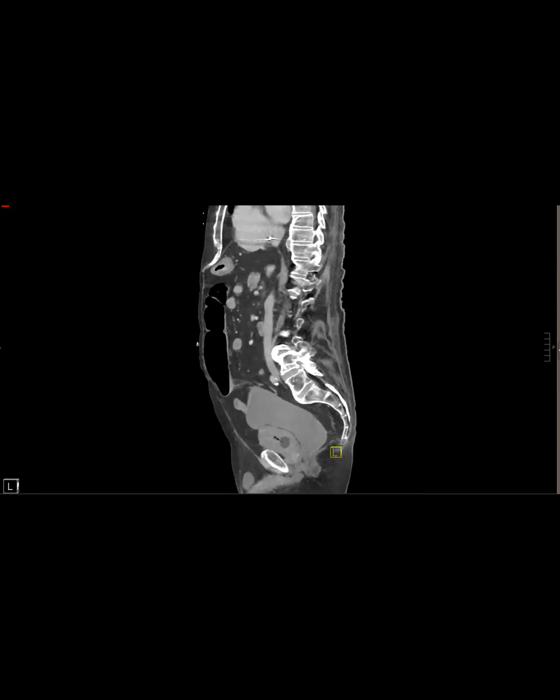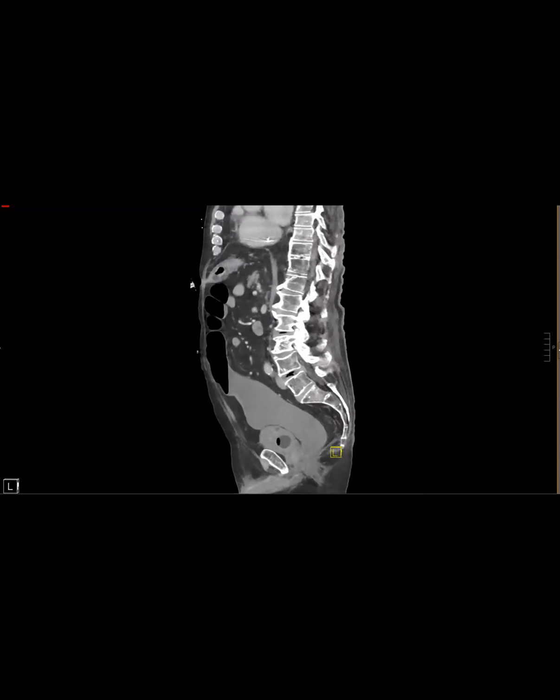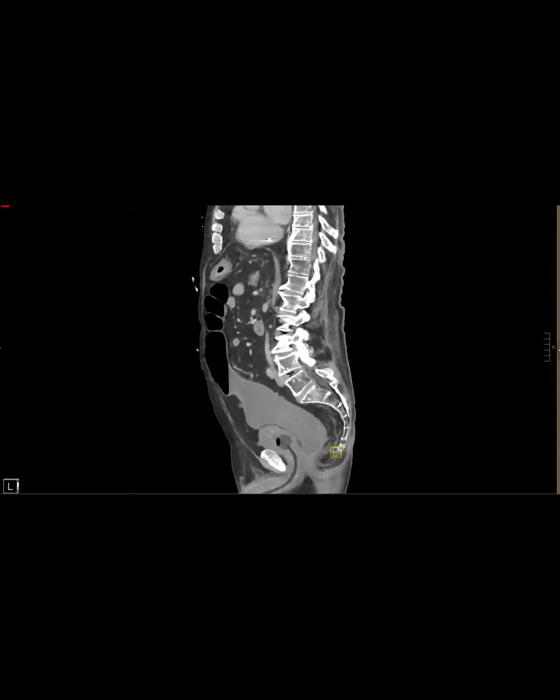Yeah, Nelly, what's up with their rectum and sigmoid colon? It looks so featureless and distended. Have they had any treatment for that, or was the bladder thought to be the problem? Do they have like ulcerative colitis?